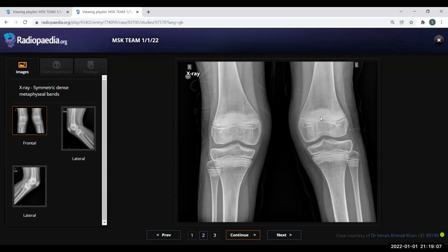So as you said, in the distal femur, proximal tibia and fibula, and you correctly gave the differentials, lead poisoning. You also said healing rickets. Other differentials, the magic 3, at least 3 differentials. So for everything, so that the examiner would be okay with it.